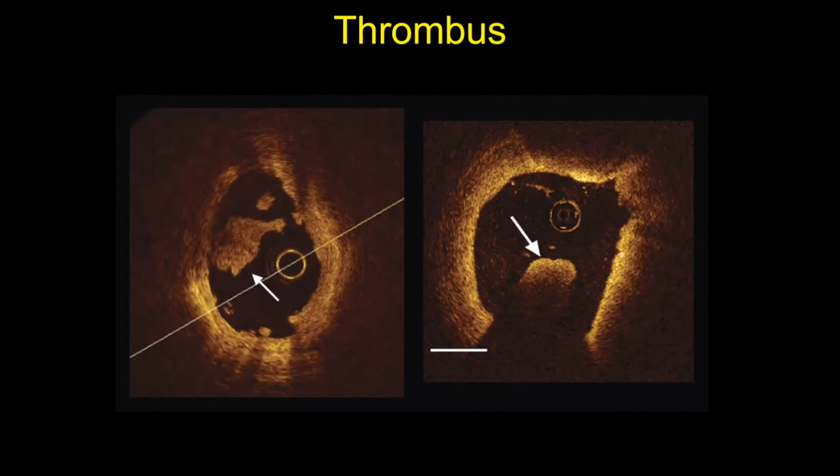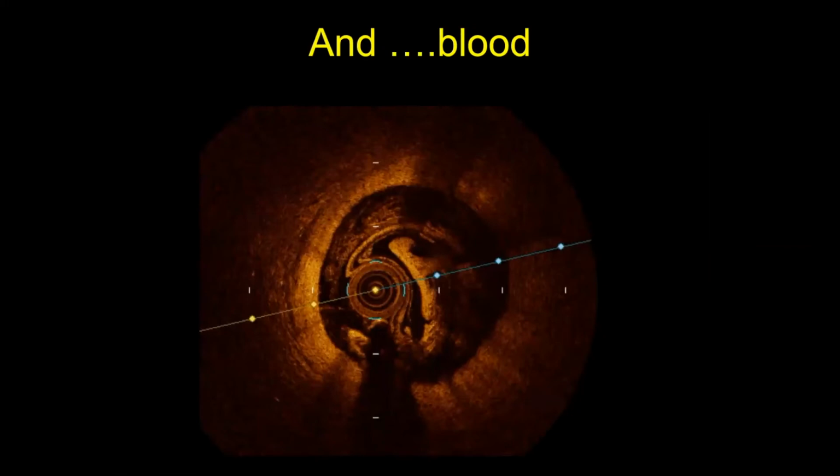The other important thing on the picture on the right is that you can see there's probably a lipid-rich plaque around, between 3 and 5 o'clock. I don't know if you want to just point that out. And then you've got this sharp demarcation and quite high, rich signal, which sometimes can tell you about the presence of macrophages, which of course are involved in plaque rupture and also erosion. Yeah, that's right. Okay.